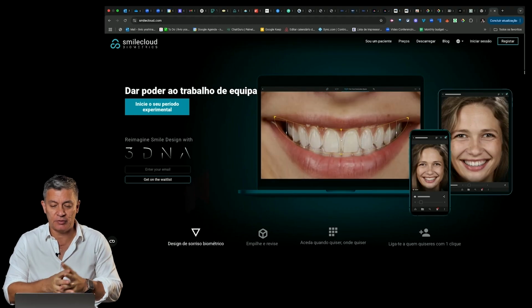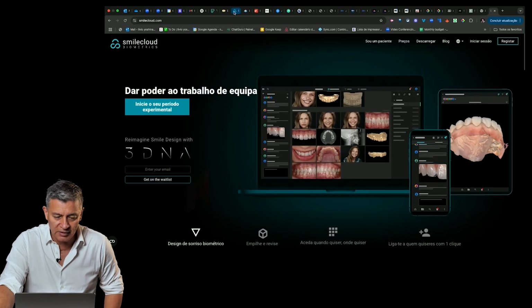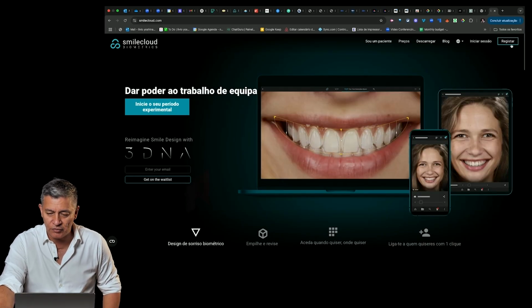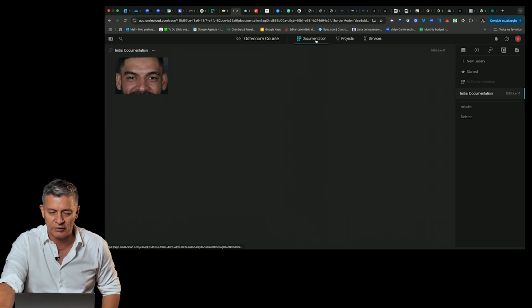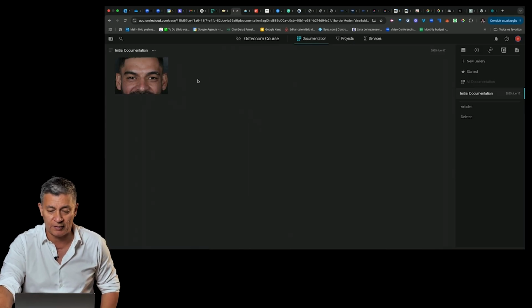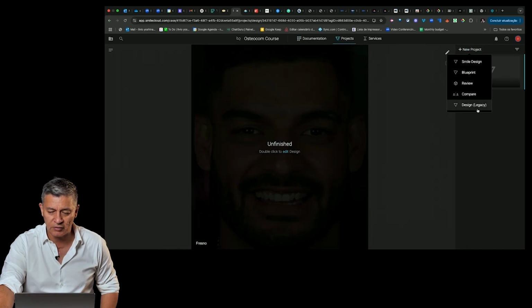Going to work and do the digital smile design on SmileCloud. This is your landing page. You have to register and then you can log in. When I open that, I can go into documentation and bring in the photo. This is the photo from Rafael. And then I can go into projects and I will do new projects and I'll go design.